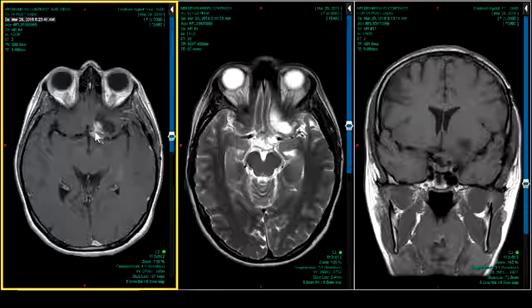Now, I'd like you to formulate in your head the family of cystic nodular lesions that would occur in the supratentorial space, because there is a differential here. And it's in a slightly weird place, isn't it, for a pilocytic tumor? It's not awful, but down in the orbitofrontal region, this is the orbitofrontal gyrus. These are the gyrus recti right here. This is the diagonal band of Broca there. You're right below the subthalamic nucleus of Luys. And so what types of lesions would you consider?